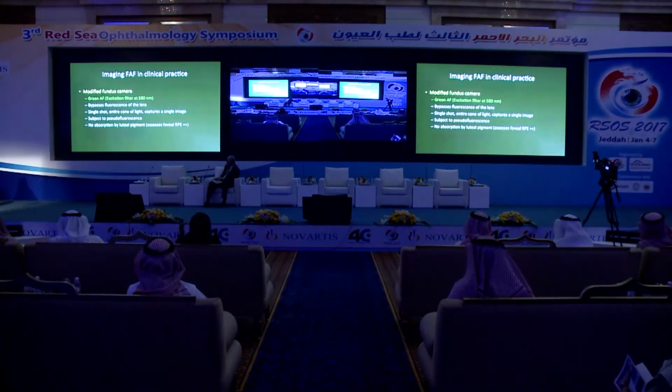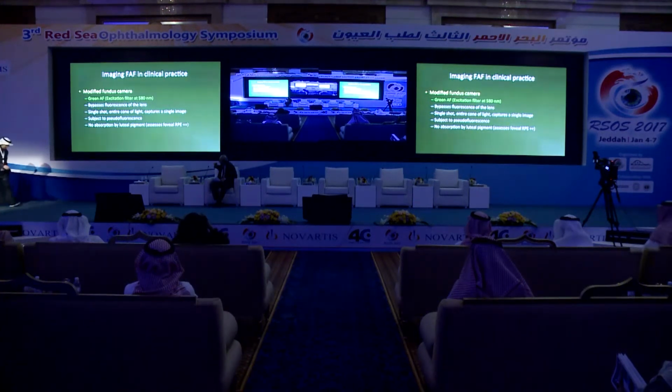With a modified fundus camera, the technique is not so expensive. We use green light to excite the lipofuscin inside the RPE, and this green light bypasses the lens, which is yellow. We focus on the fundus, we click a button, and we have a single shot, an entire cone of light that captures a single image. But in this case, of course, we don't have the advantage of having light coming only from the retinal pigment epithelium, but also from elsewhere.